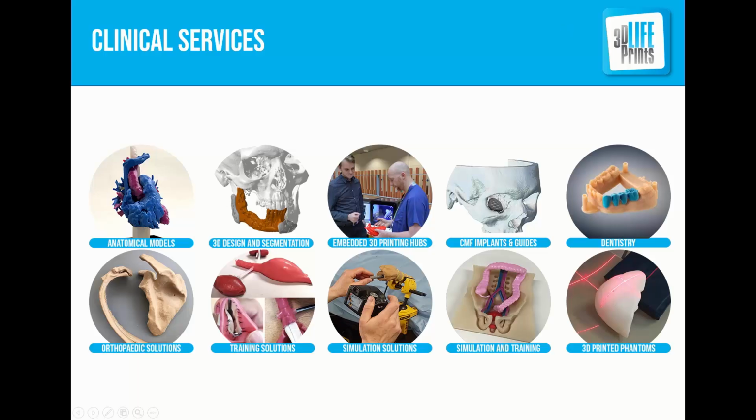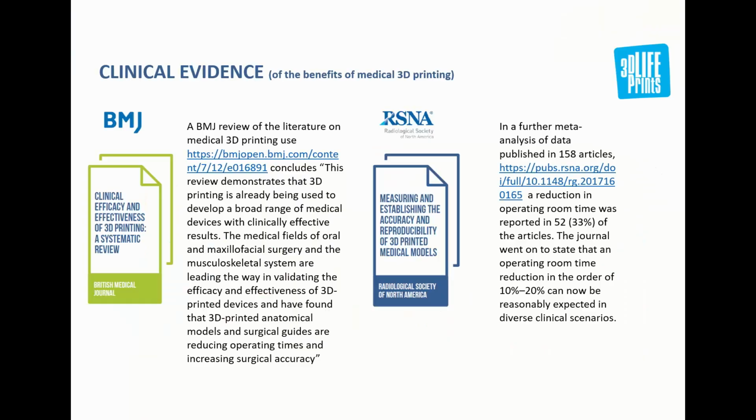I'll just hover my mouse. So this is what I talked about, the digital planning, virtual planning of surgeries and the creation of surgical templates and guides on top of patient-specific anatomies. And that can also then be used, the patient data can be used to create implants eventually. And we have wider solutions for many different medical fields, such as simulation and training, which we'll be talking about a little bit today in one of the use cases.